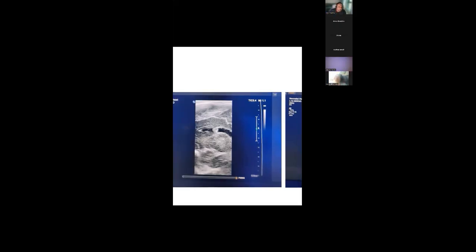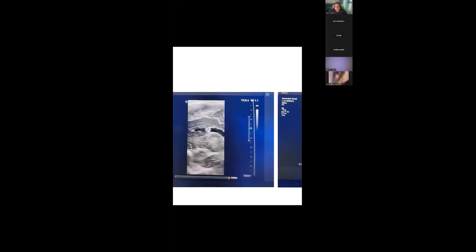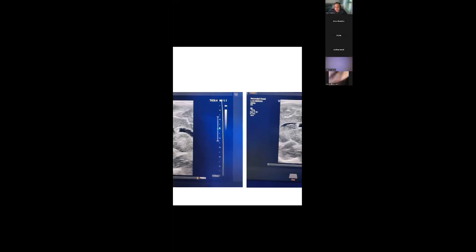The key question you'd ask is, the only other thing that this could be is a small grade 1 bleed that's resolving in the caudothalamic notch. For me, I think it's more like choroid, a remnant of the choroid.